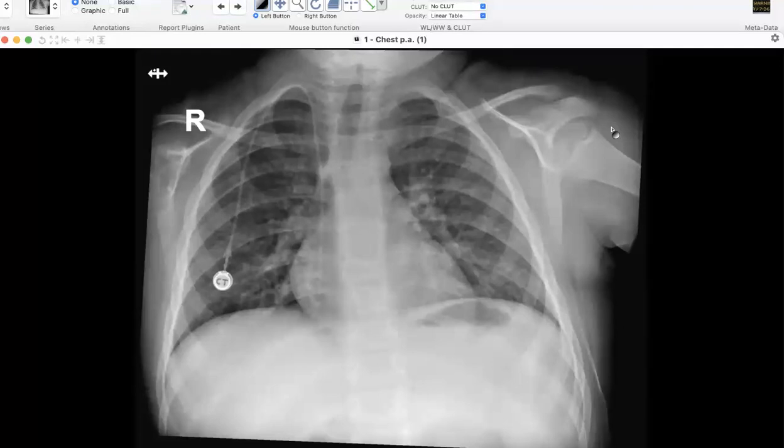What are you worried about? Why would this patient need the CT? I would definitely need to check the mediastinum for any mediastinal masses. Are you seeing any suggestion on this X-ray that you need to evaluate it further? I'm not sure. Maybe the dorsal spine is having some osteolytic changes, and maybe one of the mid-dorsal vertebrae has reduced height.